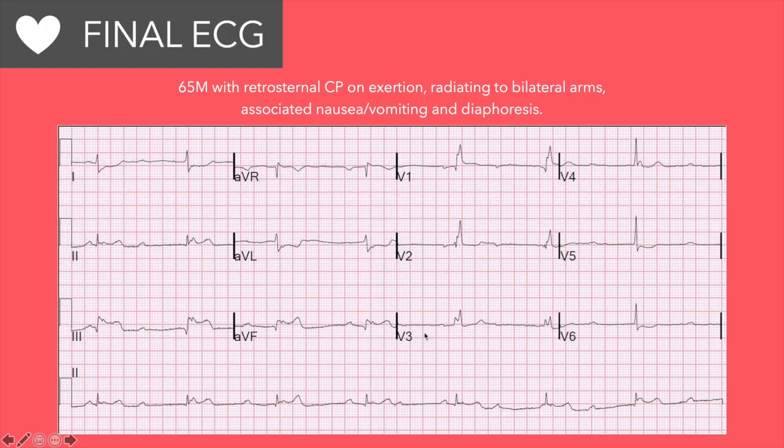Moving on to the T wave. The T wave is fused with the ST elevation in AVF and 3. There are some T wave inversions, particularly in 1 and AVL, because it's fused with the ST depressions. I don't identify any obvious U waves.